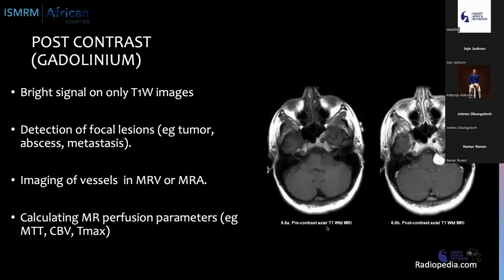And so we see this image, which is centered in the posterior fossa of the brain, gives the T1 weighted image. And something in the cerebellopontine angle on the left, right, is the pons in the cerebellum. And it's hardly appreciated because it looks so isointense to the rest of the posterior fossa structures. Upon gadolinium administration, we see an avidly enhancing lesion in the left cerebellopontine region, which extends into the internal auditory canal at this level. So post-contrast helps us to find lesions that are enhancing, or it helps us to really delineate lesions that have broken the blood-brain barrier.